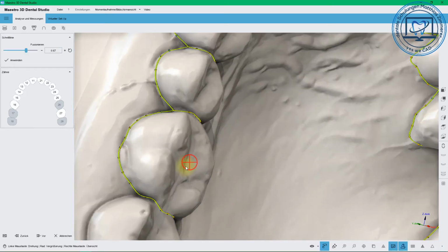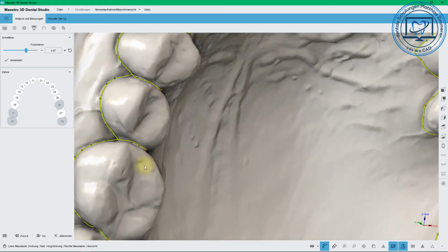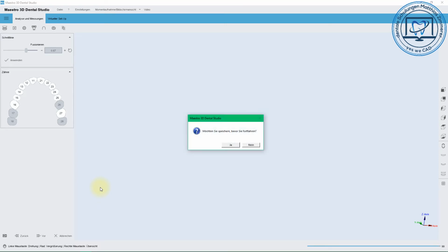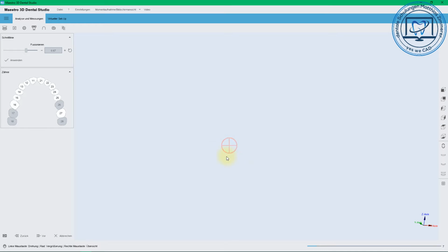It's finished, and press next. Always click yes on saving.